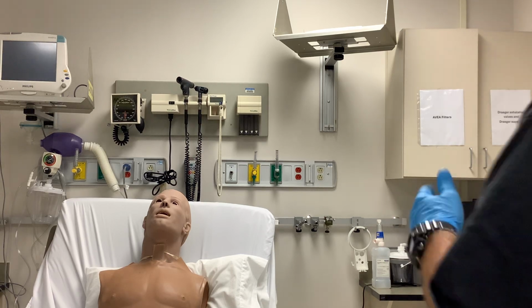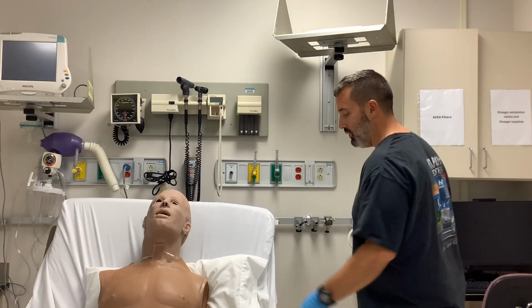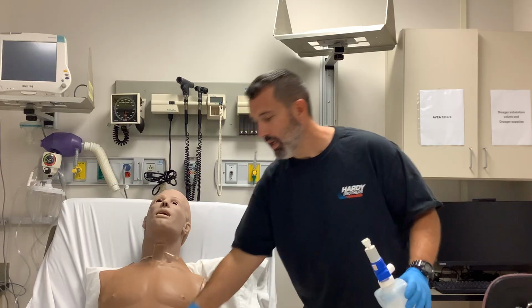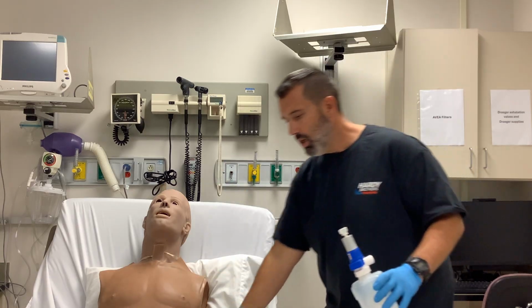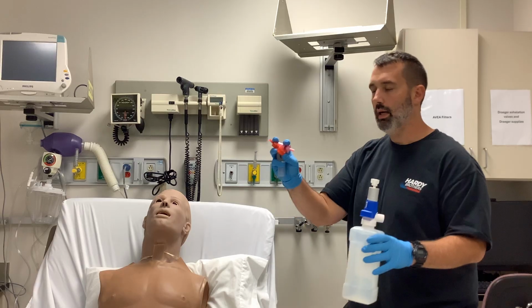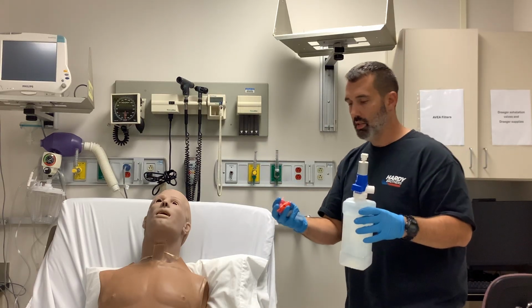All right, so we've discussed low flow devices and so forth. High flow devices, you may set up a tracheostomy collar, a face shield or face tent for a patient, and an aerosol mask. You've got different types of air entrainment devices that can be utilized for this today. I mean, they all pretty much function essentially the same way.